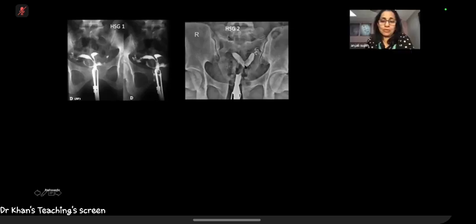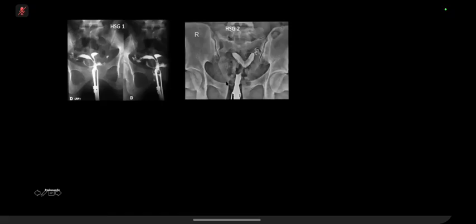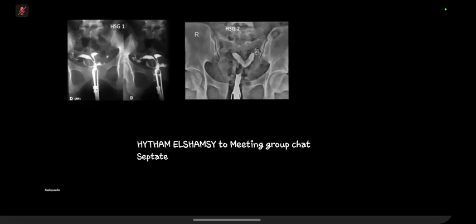And what about the one on the right side? This one has two separate uterine cavities that meet in the middle, but they meet quite a bit earlier than in the case on the left. So I think this might more likely be a septate uterus potentially, but I would need to look at the fundal contour to confirm.